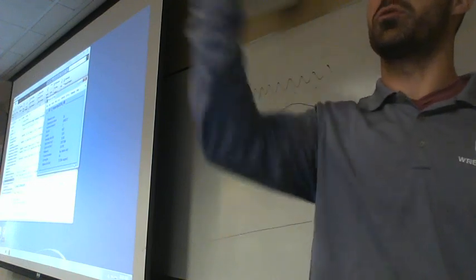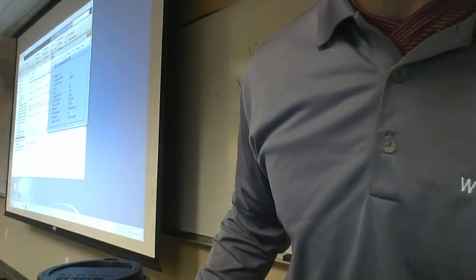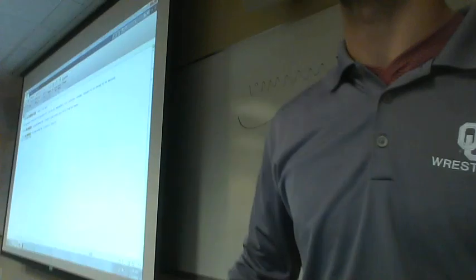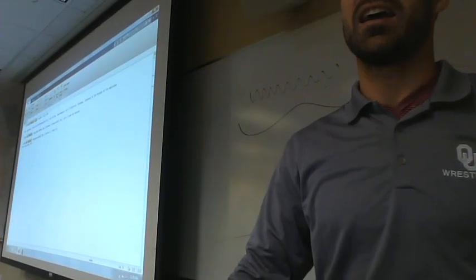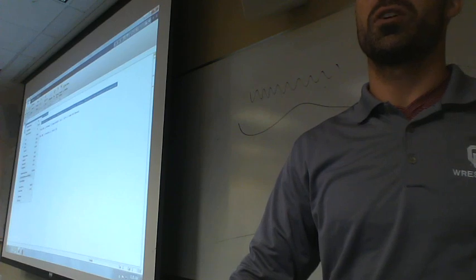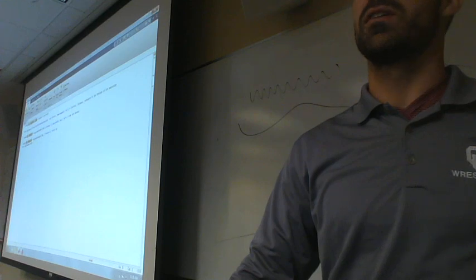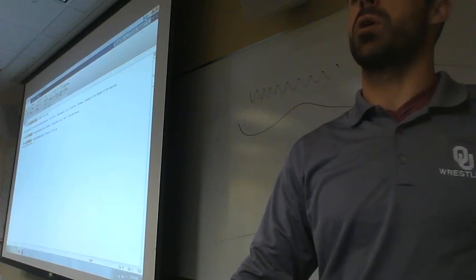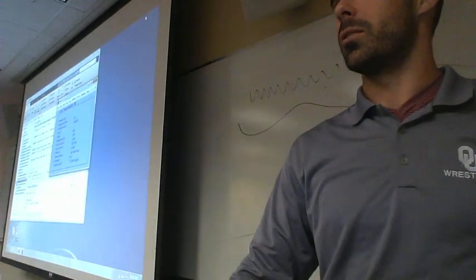And so, case in point, this is one reason why it's really useful to have our history here. When you need to go back and redo it, you know exactly what you did, right? You can just highlight this and hit run, or evaluate current section, or run here, and it'll load that in and replicate what you already did. Nobody do that except for him, but it'll just goof things up.